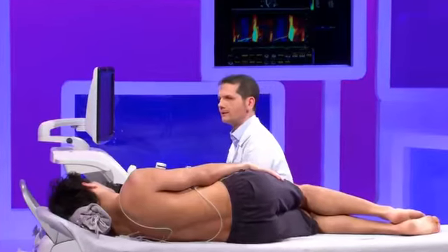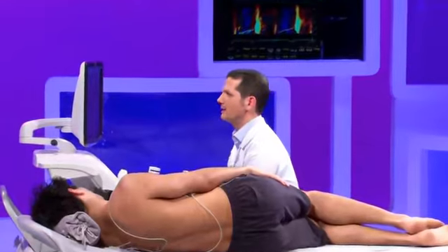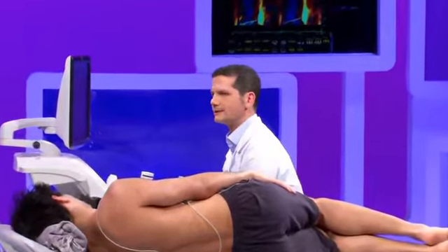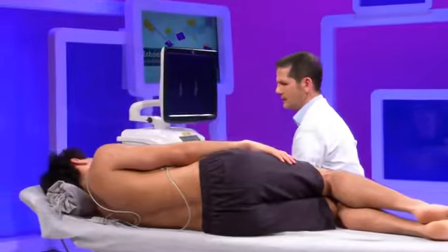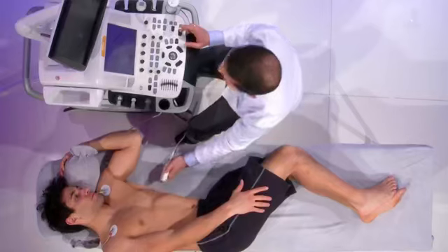Normally this ratio should be below 1 in a healthy young subject, and whenever it is increased, it may mean an increase in filling pressures. The higher the E over Vp, the higher the pressure in the left atrium. Above 2, and above 2.5, there is a high likelihood that the pressures are increased.